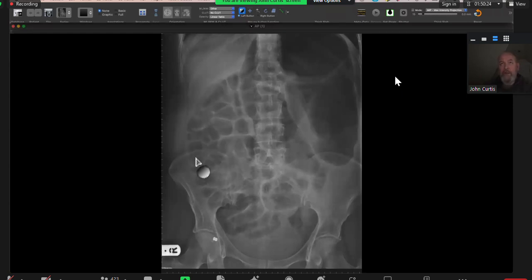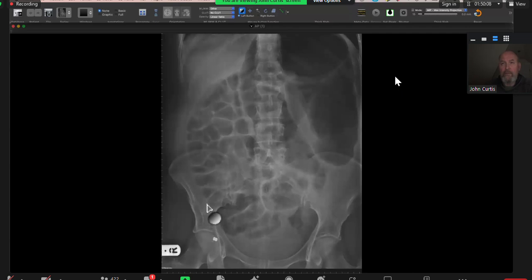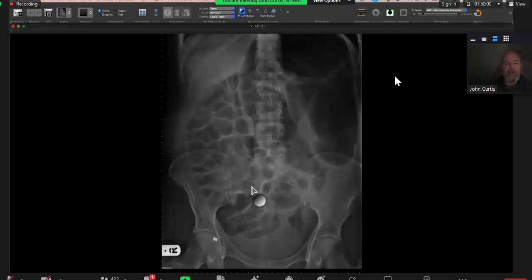Okay. So is this large or small bowel? So this is a small bowel. So what should lie in that position? There should be cecum, which should lie in this position. And so what's happened to the cecum? So the cecum has a volvulus. There's volvulus of the cecum, and it is displaced in the left upper abdominal quadrant. So what's the diagnosis? This is a diagnosis of cecal volvulus. Excellent. Okay, good. I'm going to take over the mouse now.